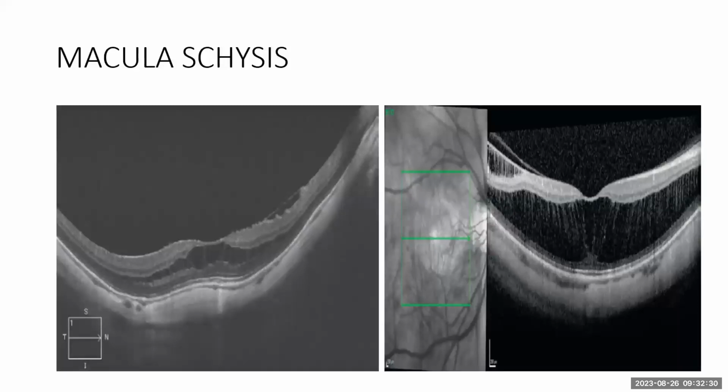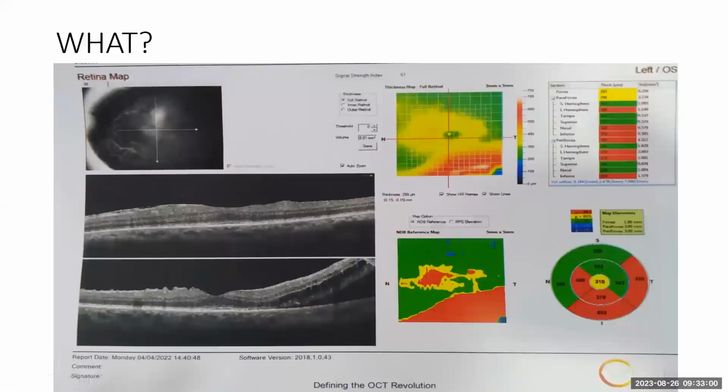It's not a macular edema, because if they had put the ETDRS map beside it, definitely it would be in red, but that's not the case. You look, the fine lines here show you that there is a pulling away. It's not fluid accumulation. This is a better illustration of the fine lines. That's why I left it here. Okay, all right.